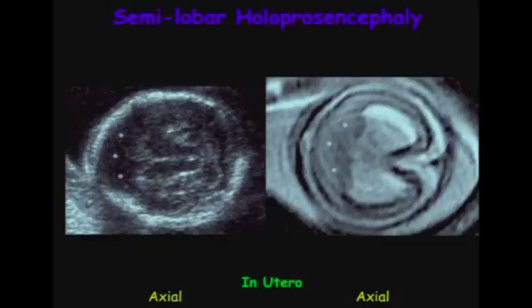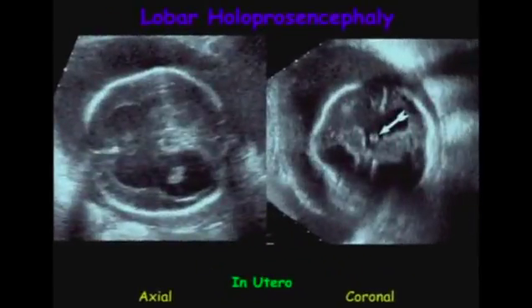There's no absolute delineation there, but notice that we have fused cortex across the front of the brain, and on the MR, the homologue, the fused cortex across the front of the brain. Then in lobar holoprosencephaly, the cleavage continues successfully from posterior to rostral right there. So we do have some separation up high, but if you go down towards the cribriform plate, there's fusion there.